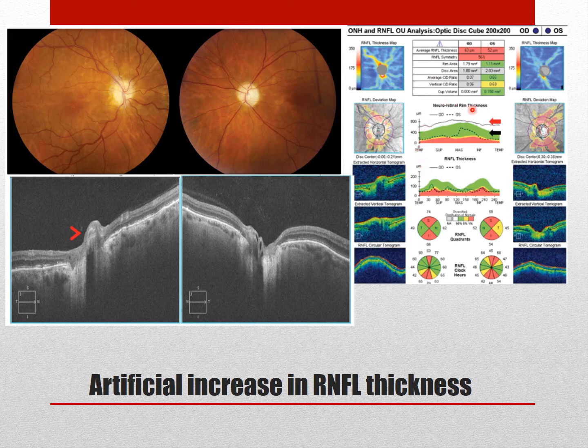All right, the neuroretinal rim: the red is in the white part. Why is that? Let's see here. Right, lots of neuroretinal rim in the right eye, because the cup is small. Look here, the cup is less than 0.1.